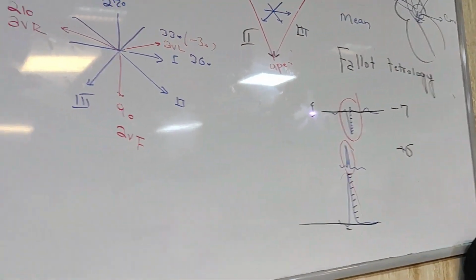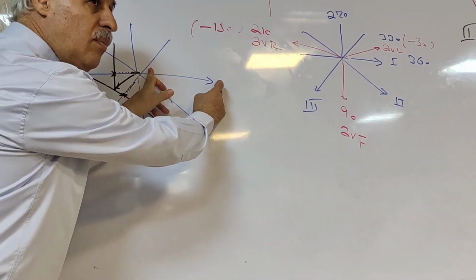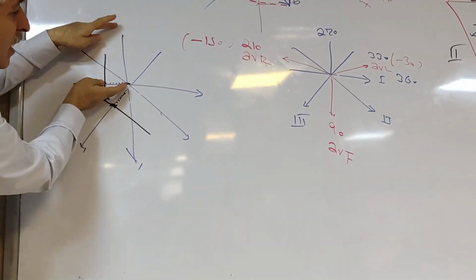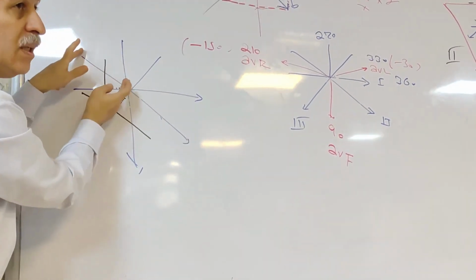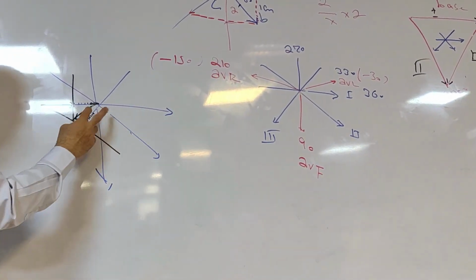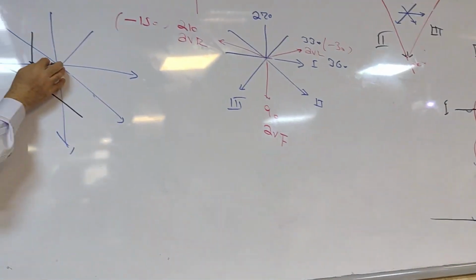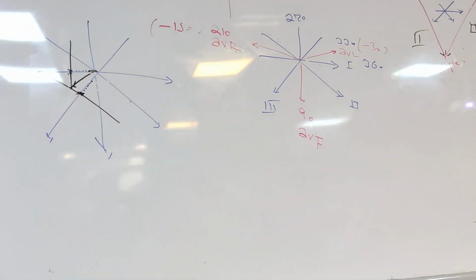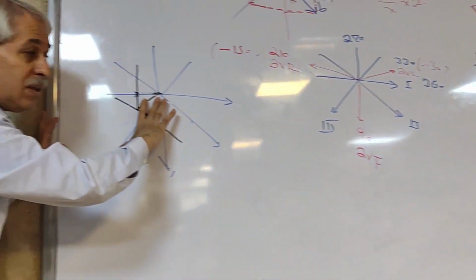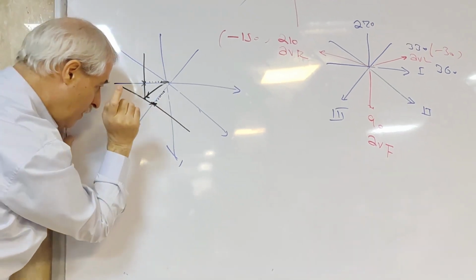And now I make the axis of each respective lead. This is the positive end of limb lead 1, this is the negative. aVF positive, negative. Lead 2 positive, negative. I have limb lead 1 and 3. In the negative direction of limb lead 1, minus 7. 1, 2, 3, 4, 5, 6, 7. Make a point. Limb lead 1, the positive end. This is the positive end of limb lead 3. This is the negative. How much? Plus 8. 1, 2, 3, 4, 5, 6, 7, 8.